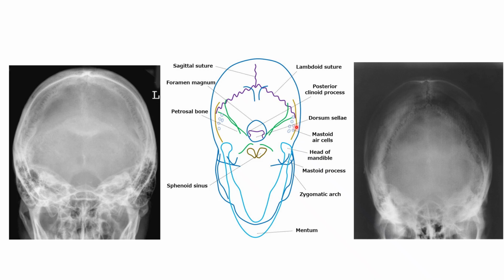Now, what I like about this drawing is that it shows us those sutures nice and clear. We can see that lambdoidal suture, and that's really what we're going to try to find on these x-rays. Find that lambdoidal suture because the lambdoidal suture surrounds the occipital bone, which is our part of interest. If we can identify that lambdoidal suture, then we can hone in and find that occipital bone encased right within that lambdoidal suture.